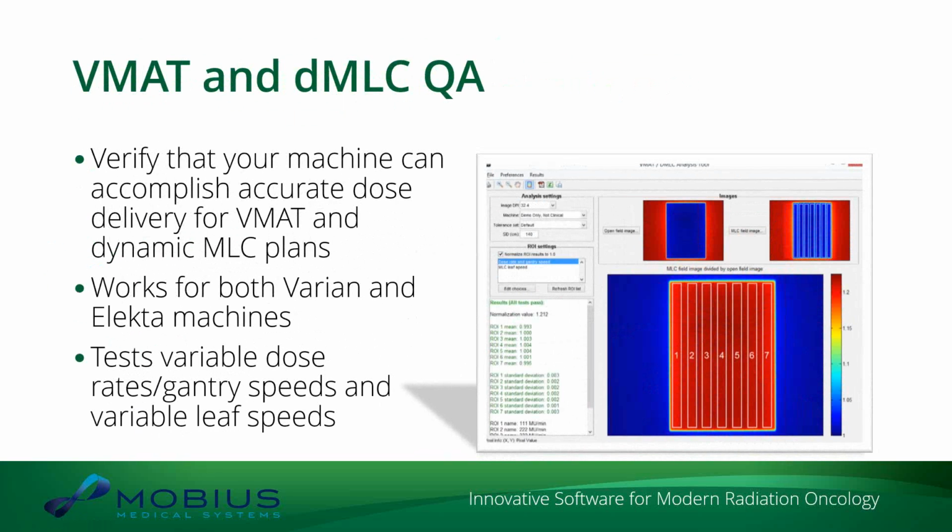And so basically this is all built right into anyone who has a Varian machine. But you can do this on an Elekta machine also. You won't have the built-in files. You'll have to actually create the delivery, but that's, I think, pretty easy to do, and I think we might even have some sample files for you for that.